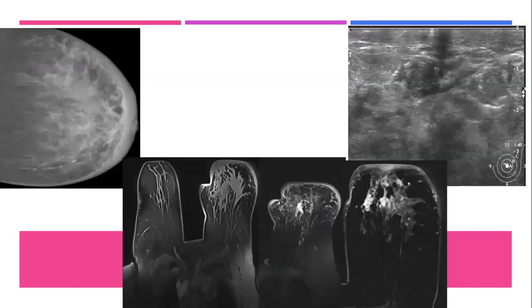Okay. Take this case. I will take this case. For the mammography, it is CC view for the left breast. So there is a large area of architectural distortion associated with thick skin, and thickened trabeculation. Excellent. Well done.